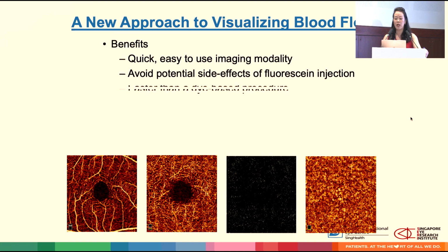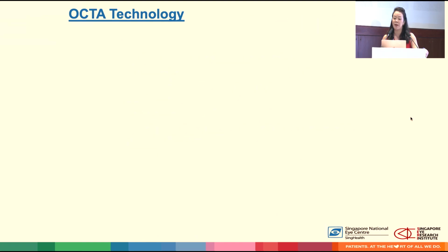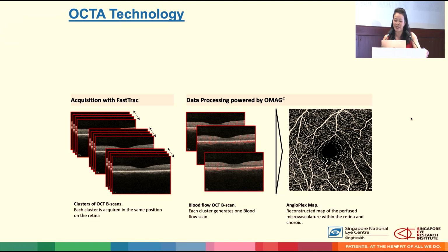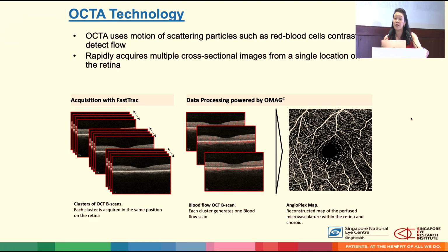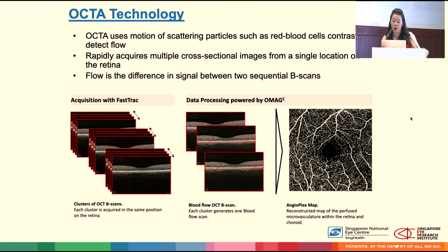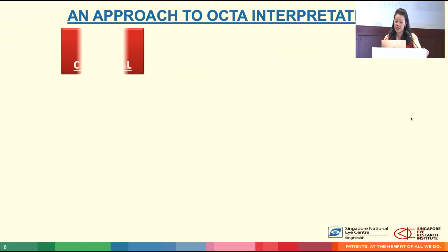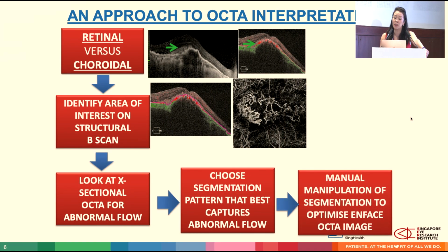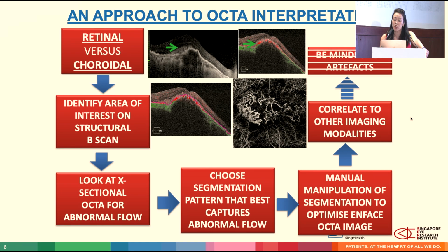And I don't need to really introduce much about OCTA because I'm sure everybody in this room in the retinal subspecialty knows about it, but it really has transformed the way we do angiography, whereby now we do not need dye anymore, but we can still see the blood vessels. And here I just give you an overview of how I interpret OCTAs, especially if you're starting.